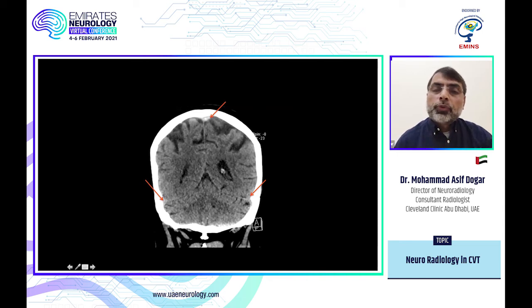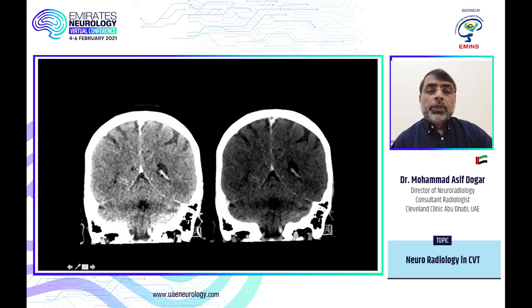Of course, we are going further to do CTV or MRV to confirm it. But again, we have to diagnose this on non-contrast plain CT. So here is the MRV, CTV. We don't see anything. As I said before, you have to change the window.